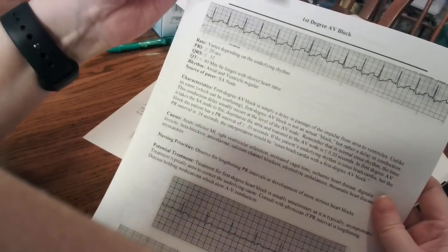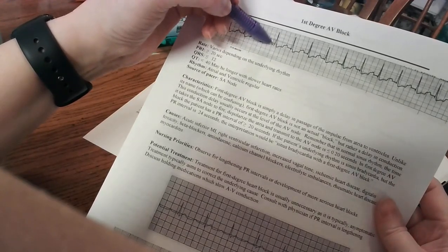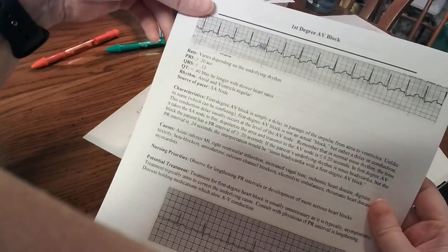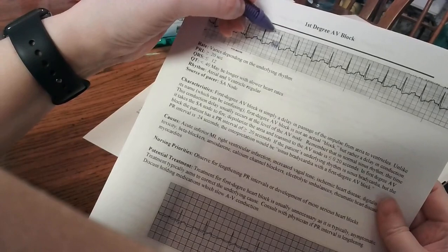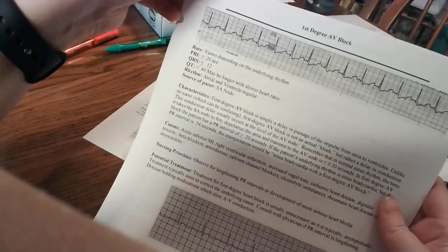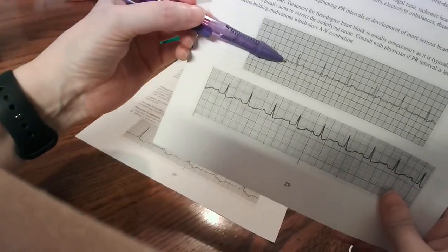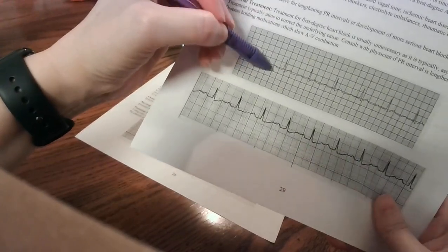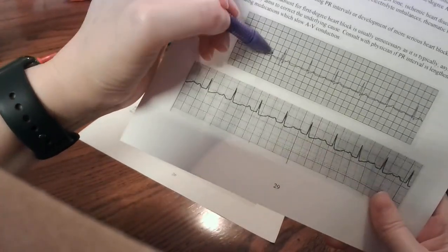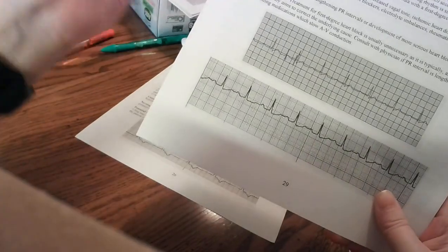It'll just be that there's a big space between the beginning of the P wave and where the QRS is. See how many boxes I've colored in there? If it's greater than one of these big boxes, you already know it's too big. That's how you do it. Down here is a couple of examples that really show it off. So way out there from here to here, and that's like 5, 6, 7, that's 8 boxes. So you're at, I can't do math, but yeah, too many.